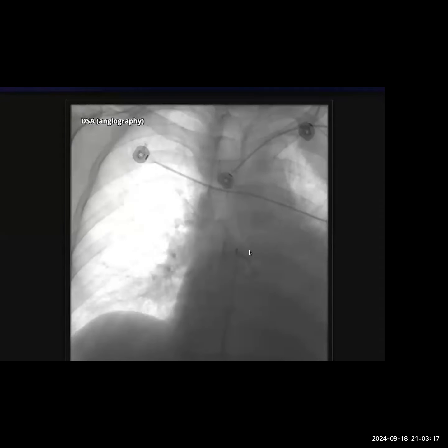What do you think is happening here? I think these are the post-procedural images, taken after the embolization. So, what do you think? If you were to think this is bronchial artery embolization, what particles do you use for embolization?